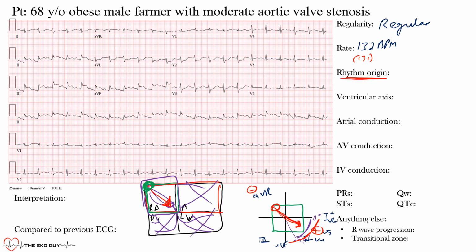So let's look at lead 1. Here's lead 1. Notice that our P waves here in lead 2, if you look up, they are upright, okay, almost blended here with our T waves, but pretty flat T waves. So they are upright there. You can see they're upright, especially in lead 2. Okay, if you look down here, that's the lead that we were showing all those P waves. So again, these P waves are upright.